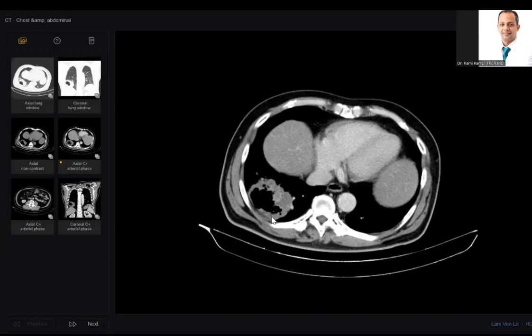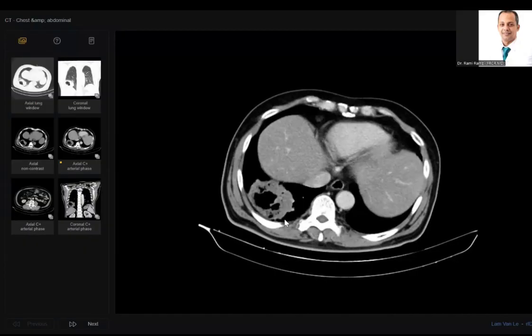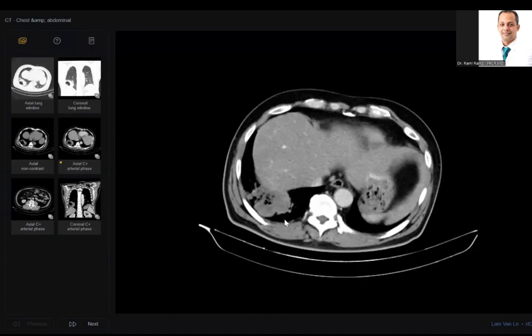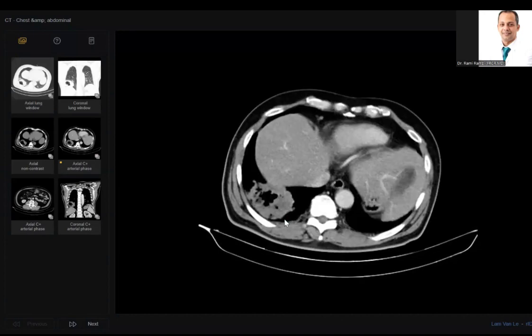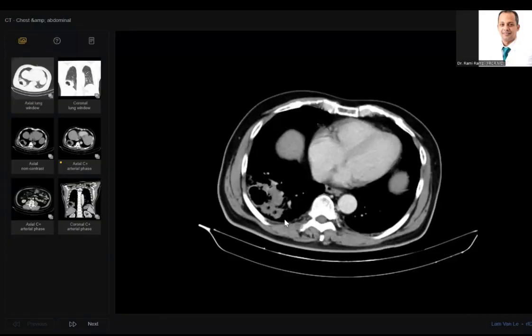The most important, my colleagues, when you are taking biopsy from the lung: number one, avoid normal lung and normal pleura. Here, almost no normal lung or normal pleura. Number two, avoid vessels like this, bone, diaphragm. When you use ultrasound, by the way, because it is real time, it gives you very good access, or even CT guided biopsy. Anyway, at least if you tell the examiner, doctor, I should go away from vessels, from ribs, from normal lung, from diaphragm, at least it is very good.